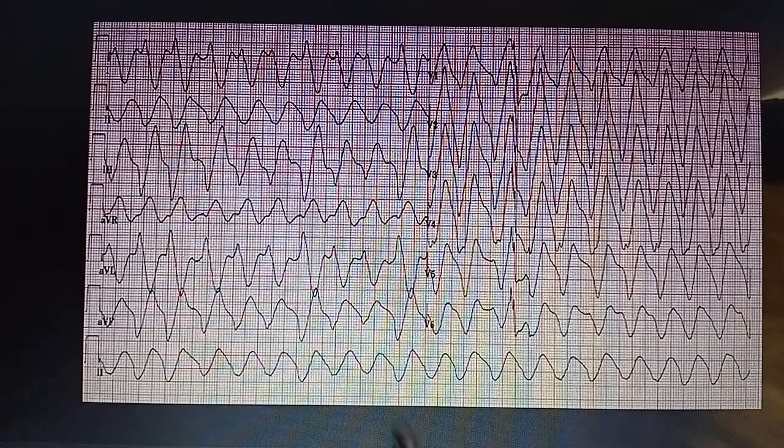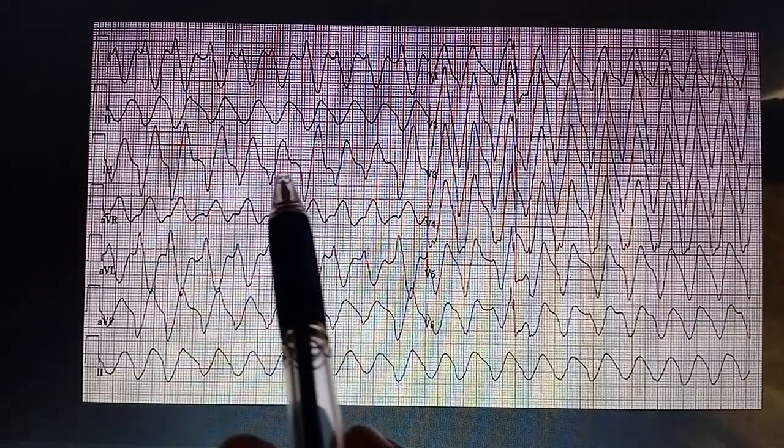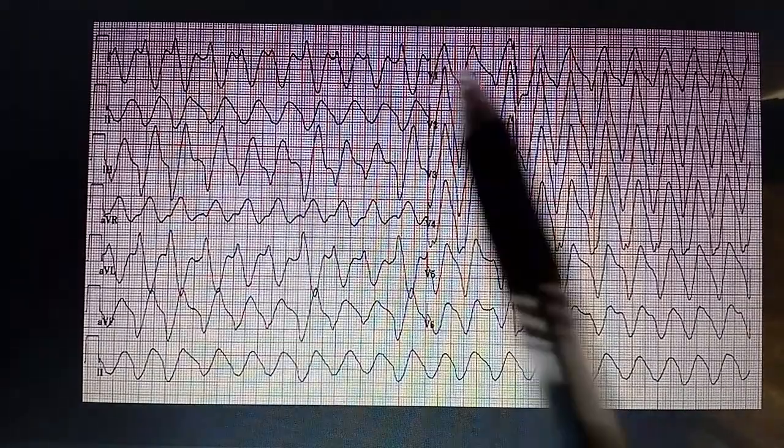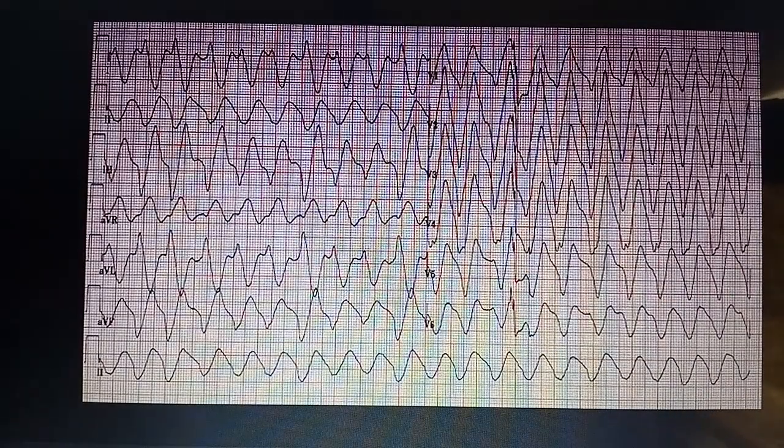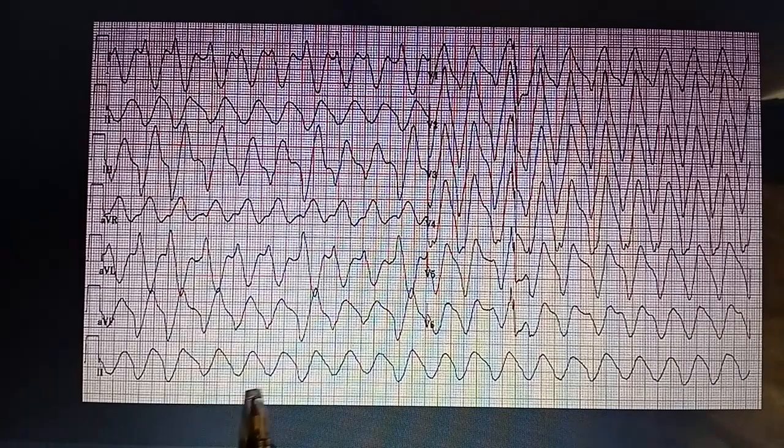So you have to keep in mind three main characteristics on the ECG of hyperkalemia. Earlier, there are tented and peaked T waves. Then later on, there is a decrease in the P wave and an increase in the length of the PR interval, then widening of the QRS complex, and then they merge with the T waves, and there is the characteristic sinusoidal pattern. So this is the classical ECG of severe hyperkalemia.